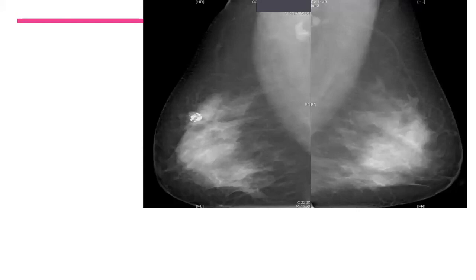These will be typical popcorn calcifications. Supposed to be BI-RADS 2. But if you look at the underlying mass, it's projecting beyond the fat glandular interface, and it is not sharply demarcated. There is subtle distortion and it is indistinct. So there is subtle disruption. This is my case. Fortunately, I did not miss it. I could appreciate this, but it can be easily missed because this is very typical popcorn calcification.